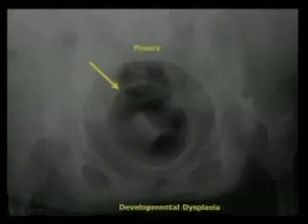But then look at this. This patient has DDH or chronic dislocations of the head with very abnormal acetabuli. This person's probably not walking around very much. It's a pessary.